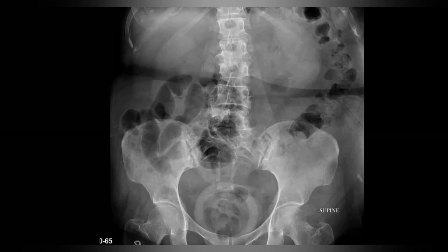So there are a number of indications for placement of these ring-like structures, that is the vaginal pessary, and it comes in different shapes as well. A few indications are for uterovaginal prolapse, for cystocele, for incontinence, etc. So whenever you see these vaginal pessaries, you have to be sure that it is normally located, and you write it down in your report.